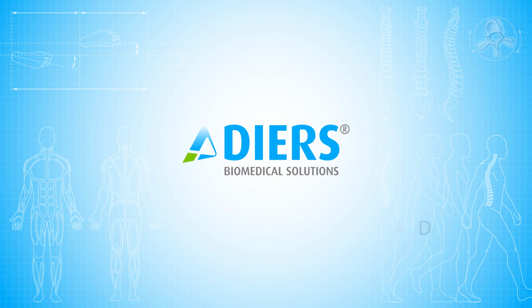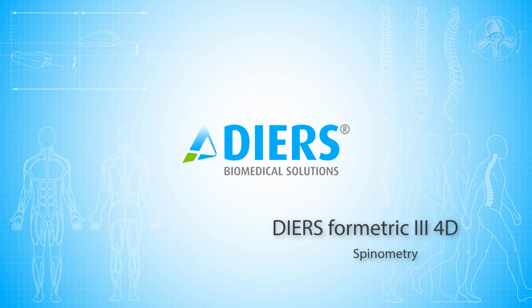The spinometry device DIERS Formetric 4D is the core product of our product line. Since its introduction to the market back in 1996, it has been able to convince a big number of clinicians all over the world to include this posture assessment tool in their daily clinic life and embrace the information the principle of video raster stereography is able to deliver.